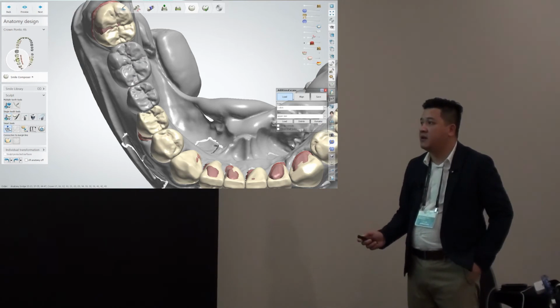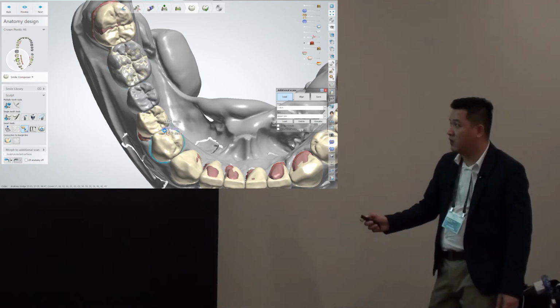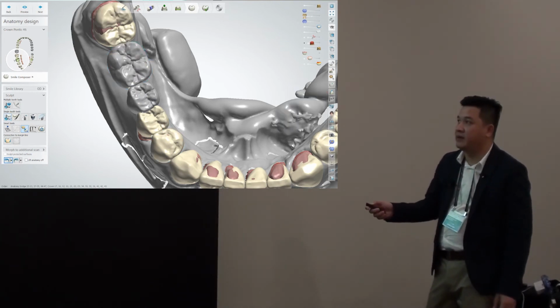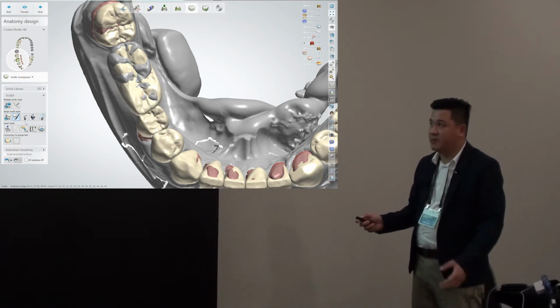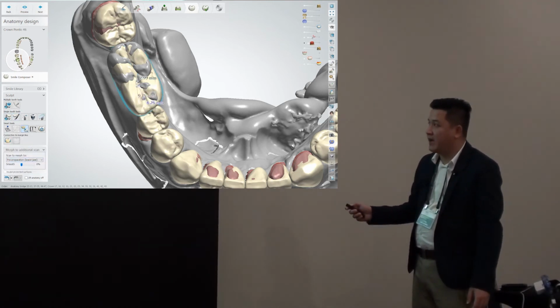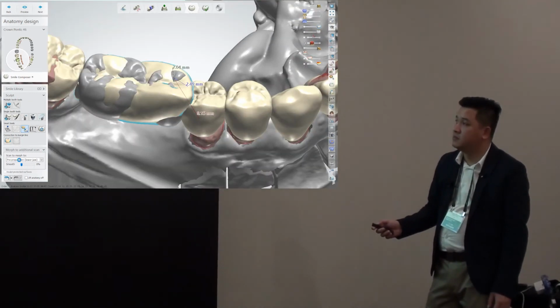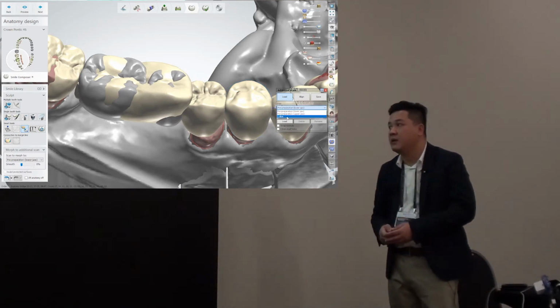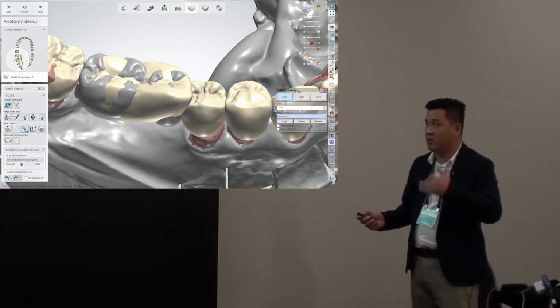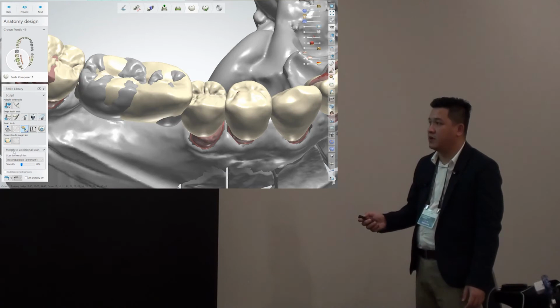And you can see here that it's there. And I made a little mistake here. I forgot to correlate the model with the lower. It's still set to upper arch here, so I'm trying to click and it's not really working. So once I figure out that I made that mistake, I go back to the additional scans tool where we end up correlating it to the proper arch. So I set 1.dcm to correlate with the lower arch.